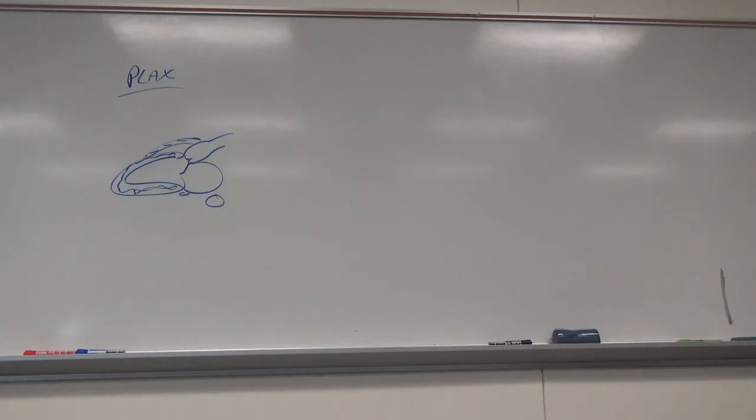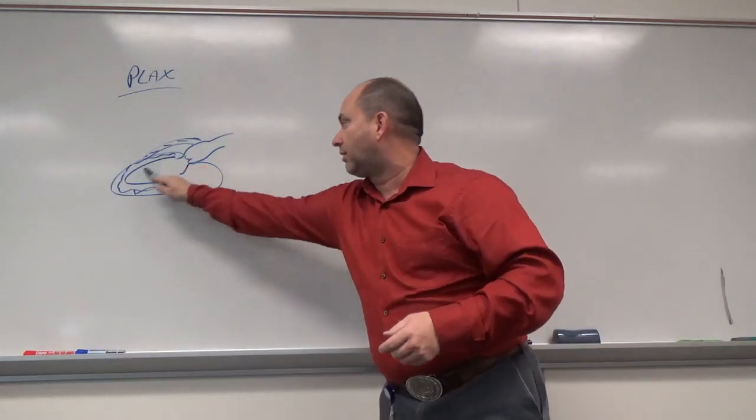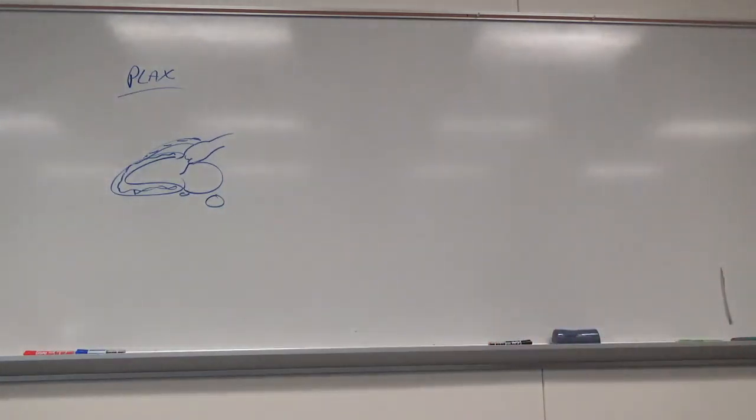So you've got to pay attention to your numbers, and you've got to pay attention to the visual perception of how it looks. And then with the wall thickening, I also want to know not just that it's thickening, but is it symmetrically thickening the way it should? Is it getting that normal squeeze, or is it thickening here and then here? Is the timing off? Okay, those things are all important to see.